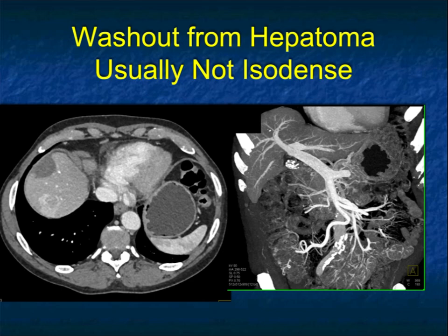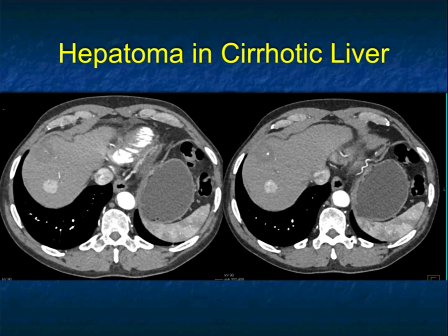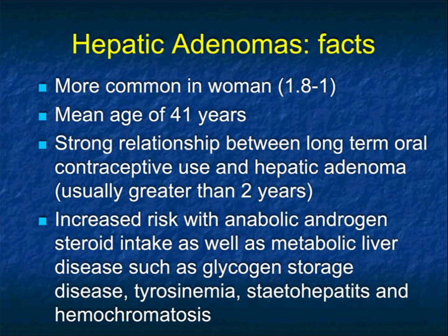Majority of lesions we see are going to be benign, FNH, hemangiomas, cysts, but you need to be very careful. And one word of caution is, in the face of cirrhosis, do not be calling benign lesions unless you have a really good reason, okay? A little helpful hint there. So again, look at the lesion. Also look at the lesion more anteriorly. That behaved very funny as well. It washed out, but they were both hepatomas.